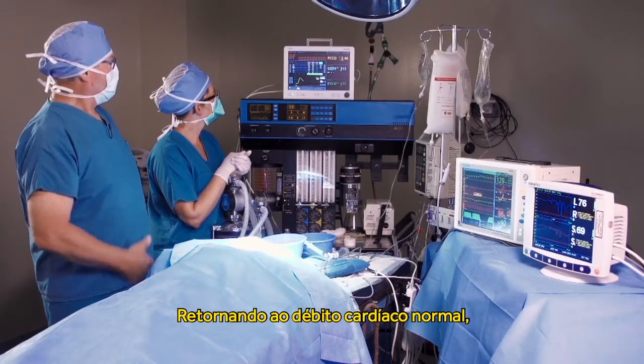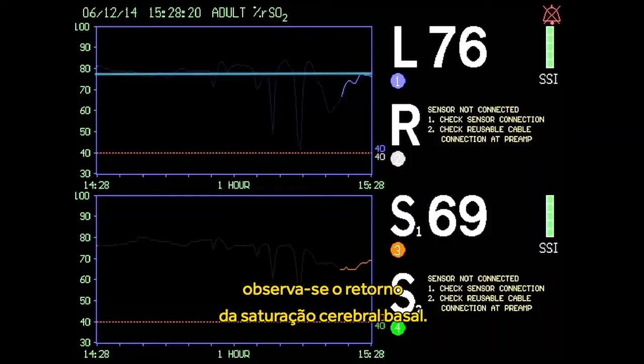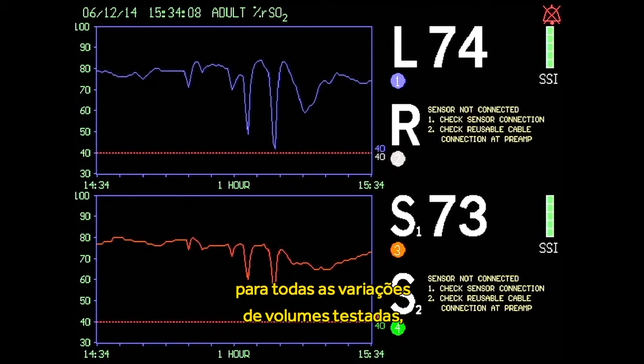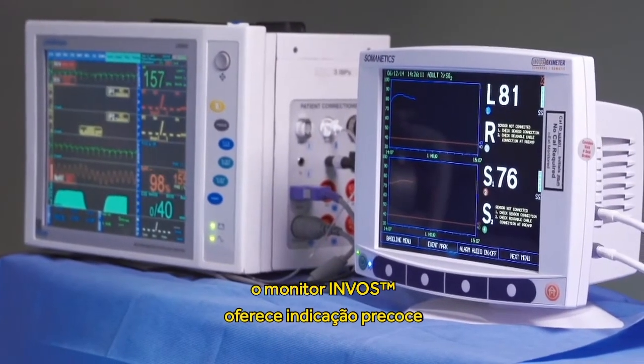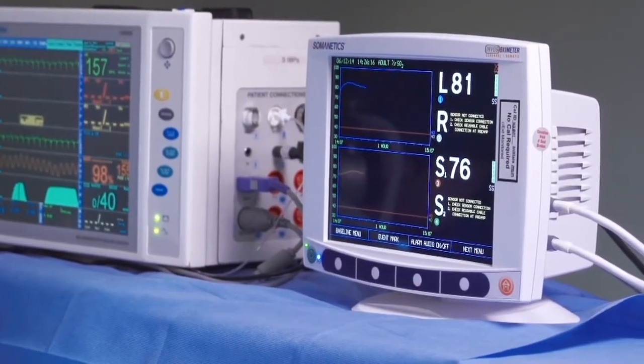Now we're back to normal cardiac output. We're back to baseline on the cerebral saturation, and that concludes our demonstration. And for all of the various models we tested, you can see how rapidly the INVOS responded. As you can see, INVOS offers the earliest indication of changes in hemodynamic function.